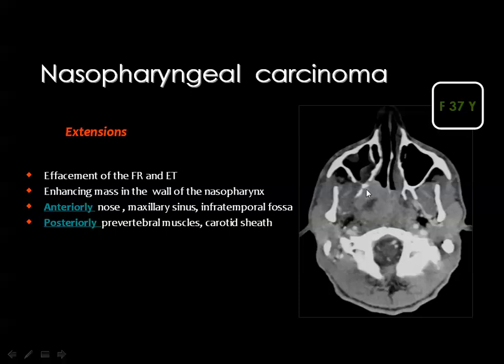Extension into in between the pterygoids. This is the pterygoid fossa, and the pterygoid fossa has been invaded. But this is not tumor, it is just sinusitis. The tumor is enhancing, as you can see here.